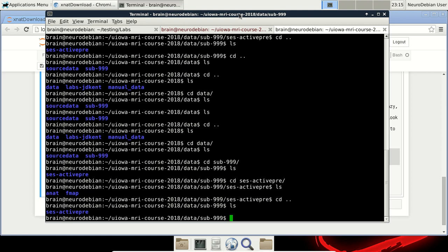But for some of the people that aren't collecting data for the class and the data is already on XNAT, you'll just have to grin and bear it and get through it. Hopefully, if I have time, I'll probably make a short little script, or help you make a little automation script, for the DCM to NIIX portion so that you can transfer the data into NIfTI format a bit easier.